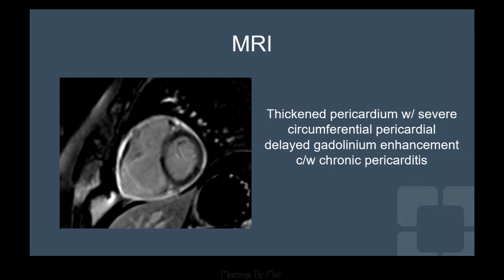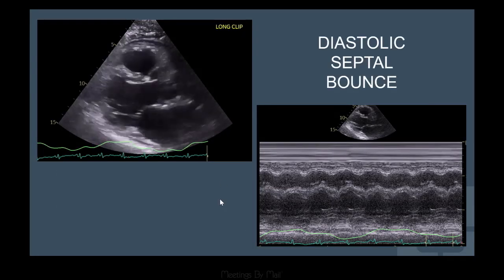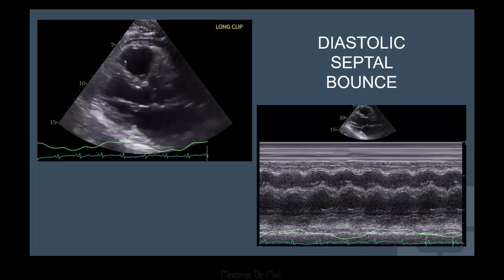Basically, you see that the white halo around the MRI is the late gadolinium enhancement. That tells me that this patient is very, very inflamed. This will take years to get better. And often, if you catch it early, perhaps the anti-inflammatories help, but this says this is a very inflammatory case. Next.